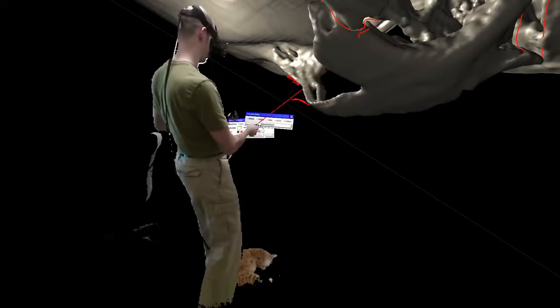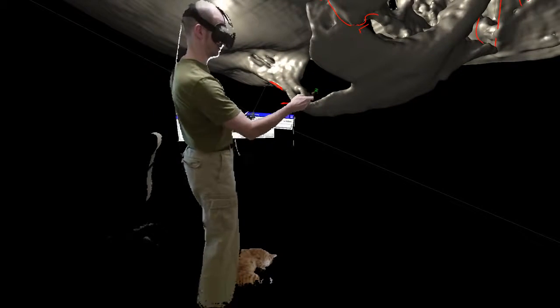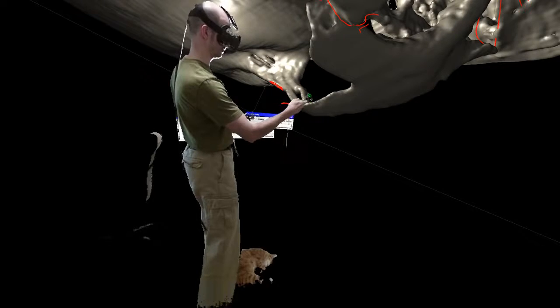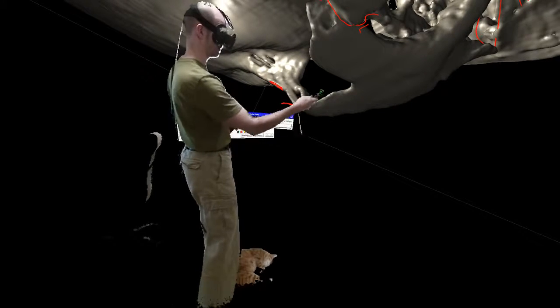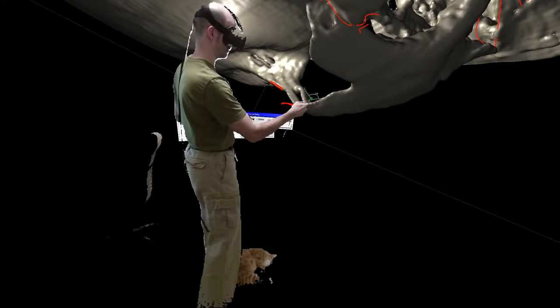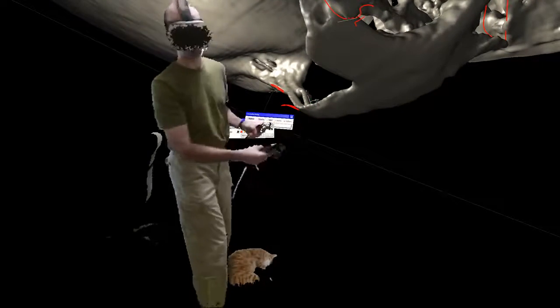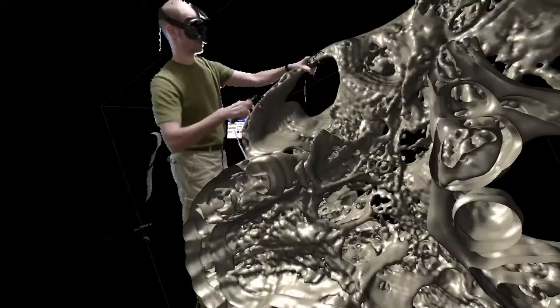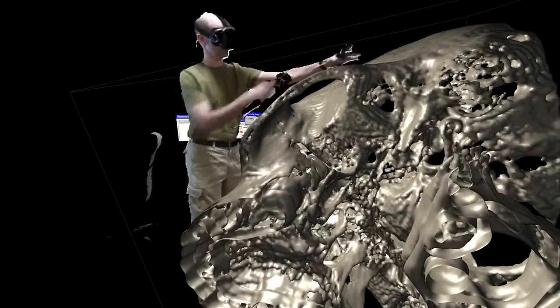And in this case, we can go in and measure the angle by putting a measurement point. Let's do it this way, and then that way, and then we can move this guy back where it belongs. And we can see that now this bone forms an angle of almost 90 degrees, 107 degrees to be precise. If you compare that with the other side, you can see this is what it's supposed to look like, nice and smooth, going across, not bent like that.